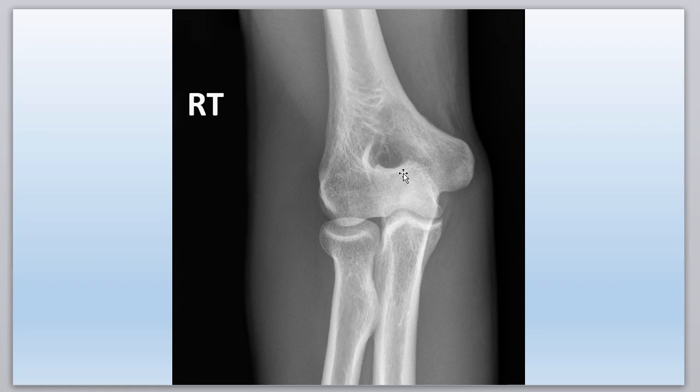So there's a coronoid fossa here, and there's a radial fossa. You can't see those. You can see the vicinity of where they are, but you can see this knob right here. And then you can see this double knob right here. So that's the trochlea. This is the capitulum. Trochlea is right here. Coronoid process is right here. Okay, so let's move on.